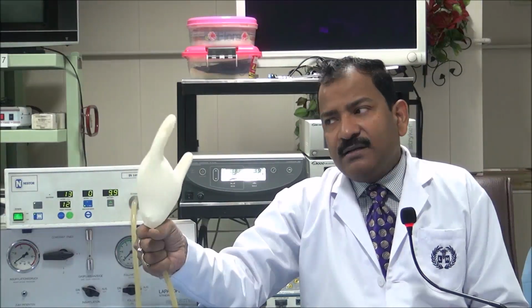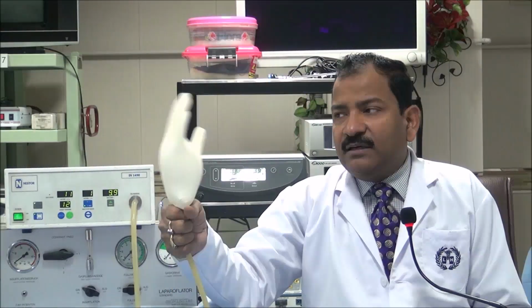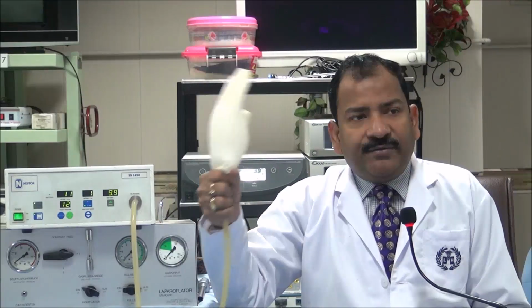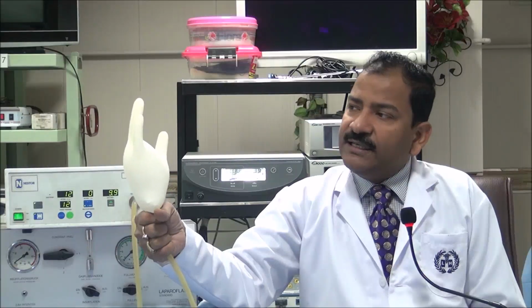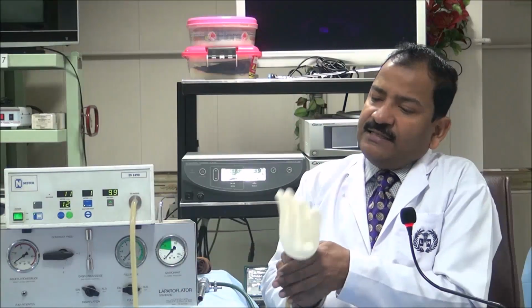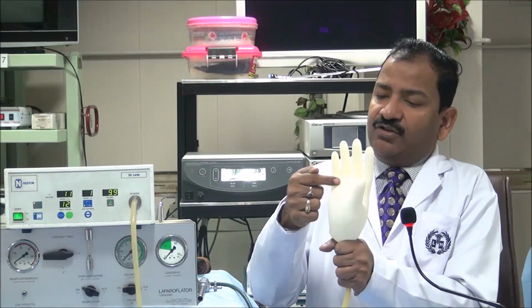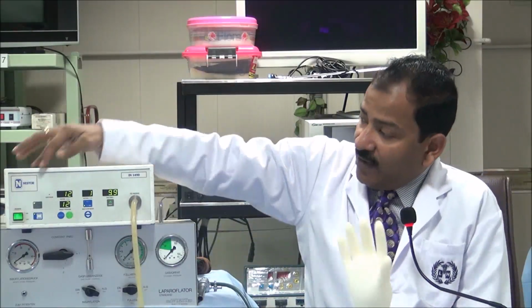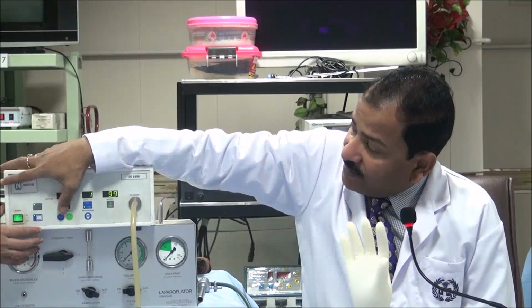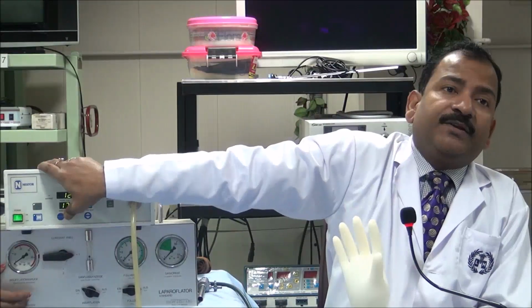But remember, if I hold this glove like this, even for 2 days, the glove will remain this way. See this glove. You can see beautiful wrinkles here. Can you see those wrinkles? Yes, it can bend beautifully. Now I will show you what happens if I increase the pressure.